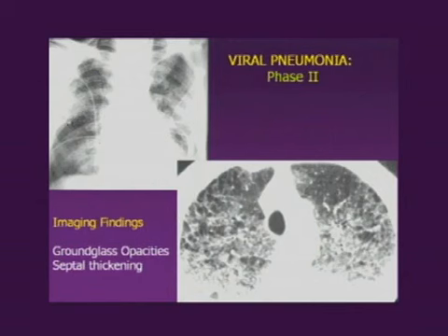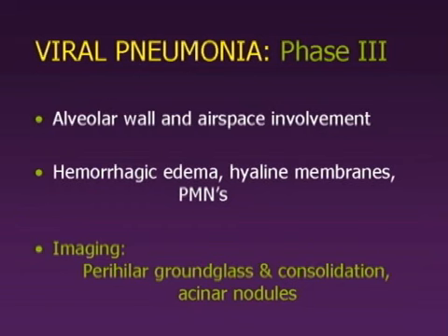Radiographically, we see hazy, increased lung density with a superimposed meshwork of reticular markings representing the septal thickening, and the correlate on CT shows, again, regional areas of ground glass attenuation, representing the lung inflammation, with septal thickening representing the accumulation of inflammatory cells in the interlobular septae and intralobular septae.